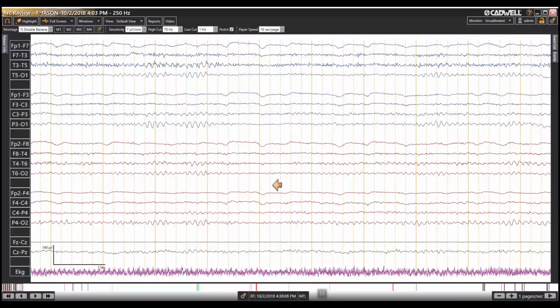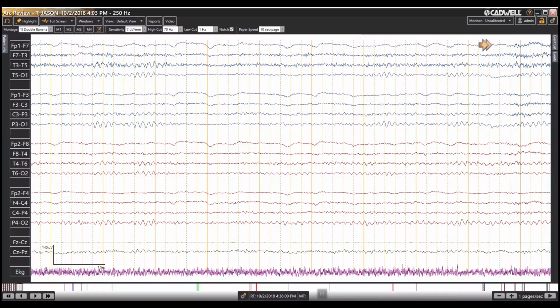Windows behavior in ARC. You can access the review windows by clicking on the Windows option in the top toolbar of the ARC review screen. This gives us several different options: synopsis, associated documents, highlights, persist, record edit window, review window, and adding and removing traces. There are other options as well.